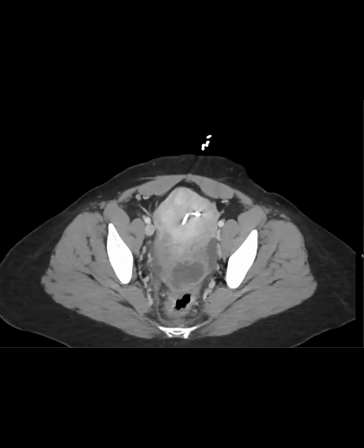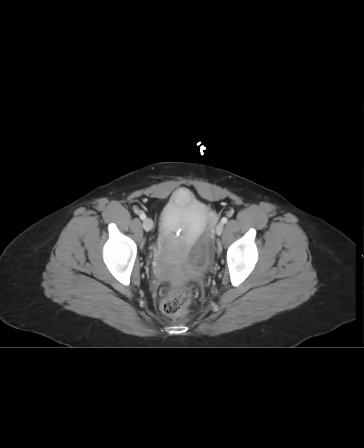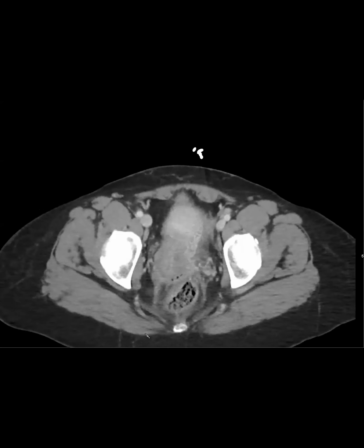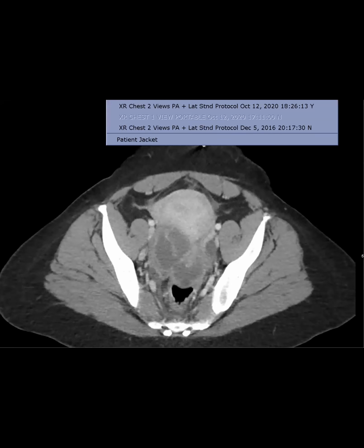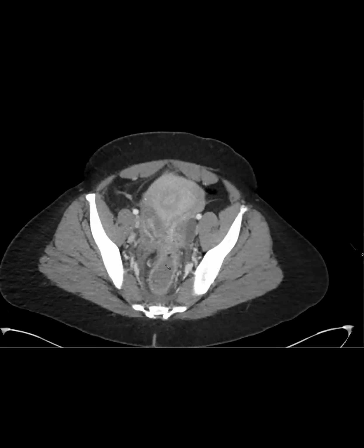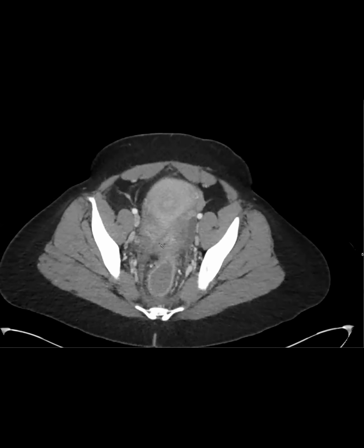And there was a consult for a drain. And you can see that it's not great, there's a lot of vessels in the way here. You want to stay as close to the sacrum as possible to stay away from your neurovascular bundles and your sciatic region. So anyway, our interventional colleagues ended up doing an ultrasound guided drain placement, and they went transrectal. And this is their post-transrectal. So you can see that the drain is going through the rectum right there, just went through the rectal wall and into the collection.